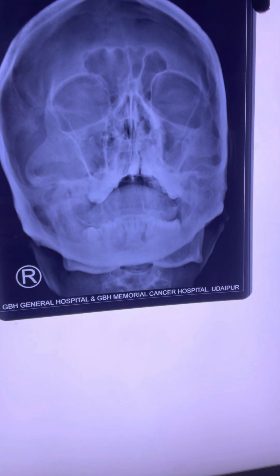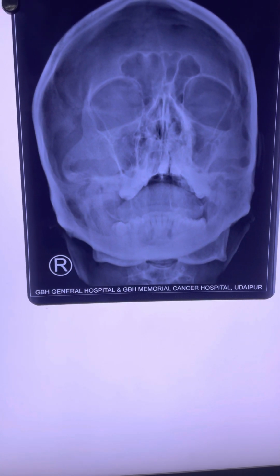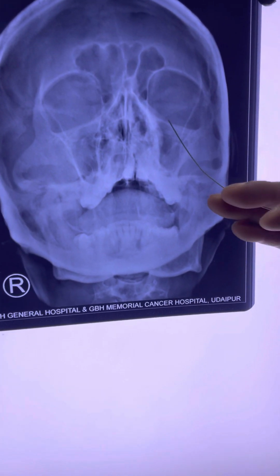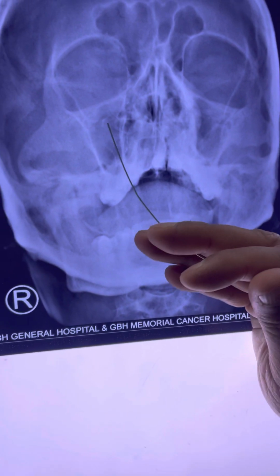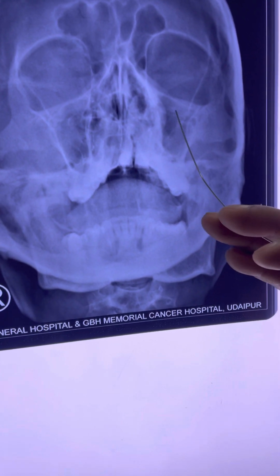Now, remember that we are not going to read this as an X-ray of paranasal sinus which is showing sinusitis. We are going to take any one axis. Let's start with the maxilla first. If we see the maxilla, let us first see the boundary, if all the walls of the maxilla are intact or not, and compare it with the other side. Then we can see the radiolucency in both the cavities with air column in the center. So air appears black.